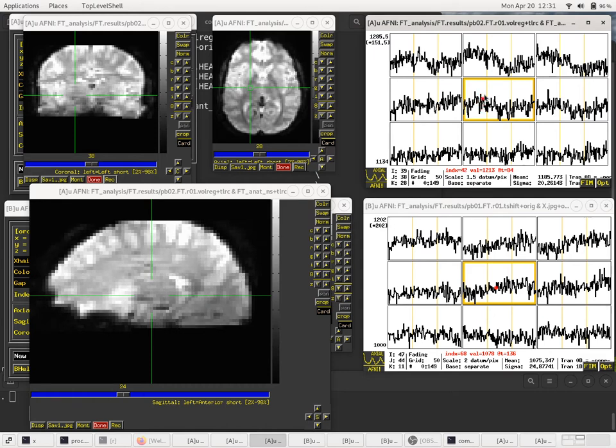And you notice that you saw some motion there, but if we go back, that's an artifact. That's where our volreg results kind of fail. So it was corrected there. Let me jump back and forth. 40, 41, 42.